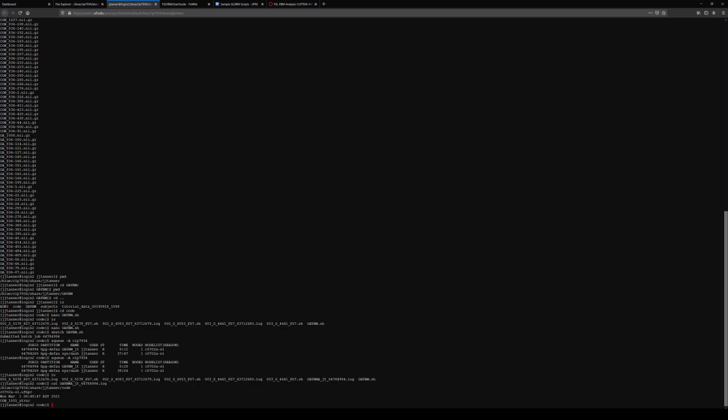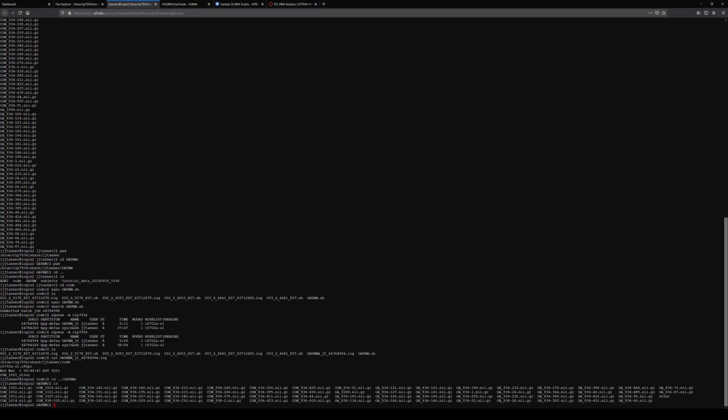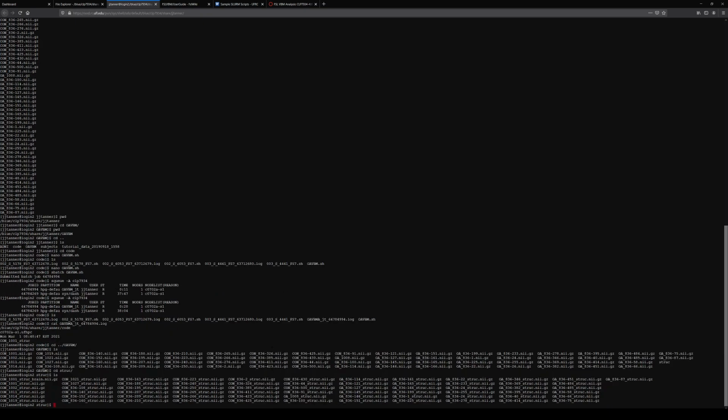So it's giving something. So it's saying con 1001 struc. And so I'm going to go into the OA directory. And now what we can see, so I went up a level and then down into the OA VBM directory, so navigated. And now what we can see is there is a directory called struc in here for structure. And I can go into there, I can list the contents. And so now these files are being copied into there and renamed, just putting struc on the end. And then it will start to do the processing.